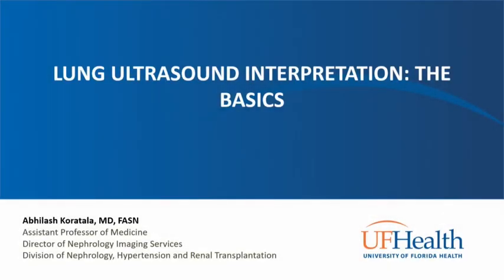In this video, I'm going to briefly talk about the interpretation of lung ultrasound as it pertains to nephrology practice. Lung ultrasound is one of the easiest scans to perform and a very useful tool in assessing the volume status of a patient when interpreted in conjunction with physical examination and findings from other ultrasound exams such as IVC and the heart.